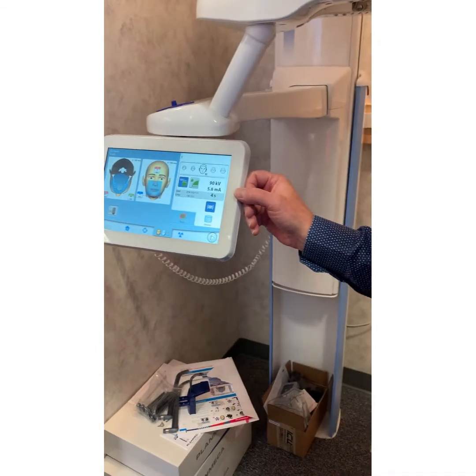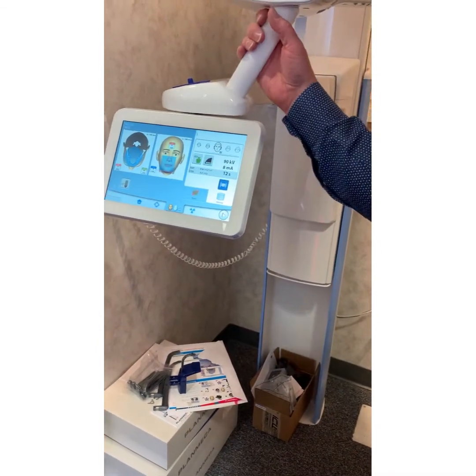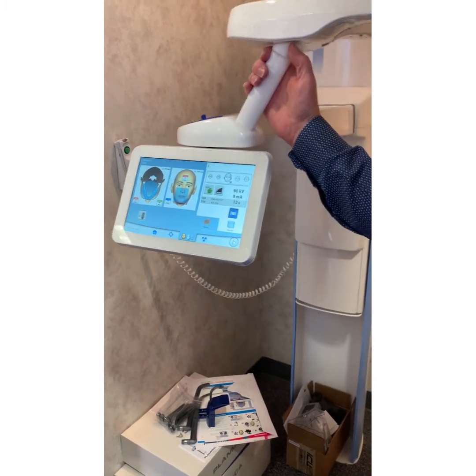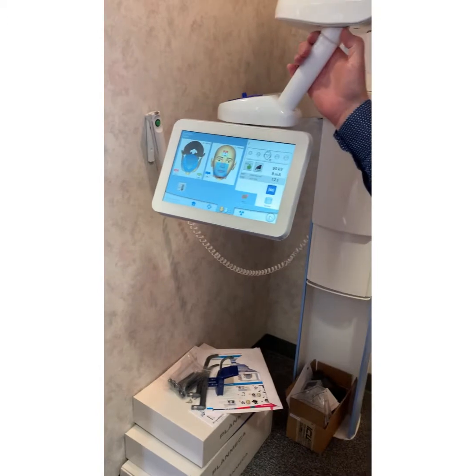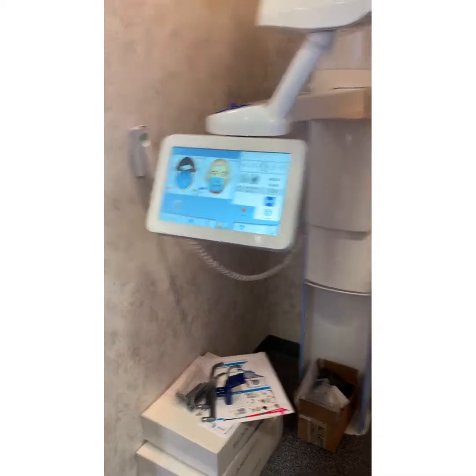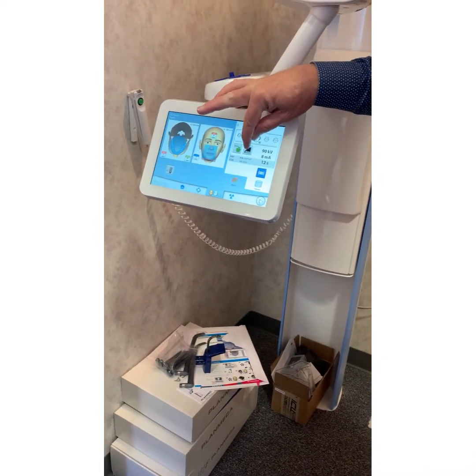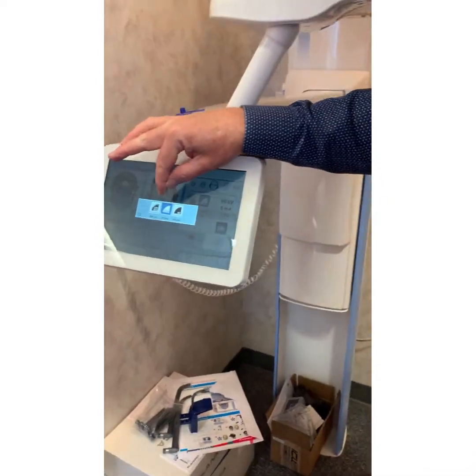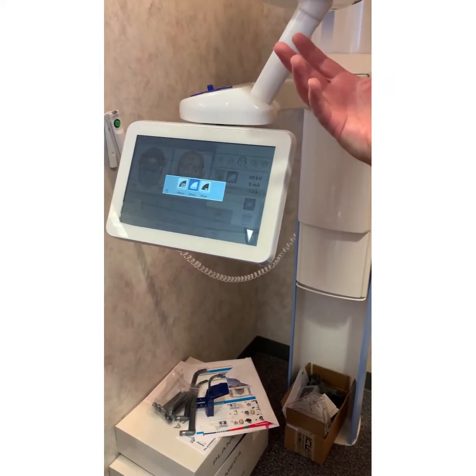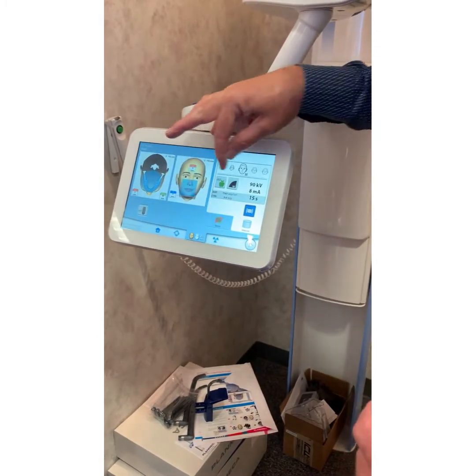So there are offices that use it all the time, some of the time, rarely. It's up to you guys. It's not really going to affect his image, what he needs to see. So maybe it's best to just use it all the time. The noise is going to be in the soft tissue areas, not around the cortical bone and the PDLs and the things that you're looking at. Here's your resolution for 10 by 10. I would recommend normal, unless he says, "Hey, look, I'm looking for some pathology that I need a little tighter focus." Then HD is good too.